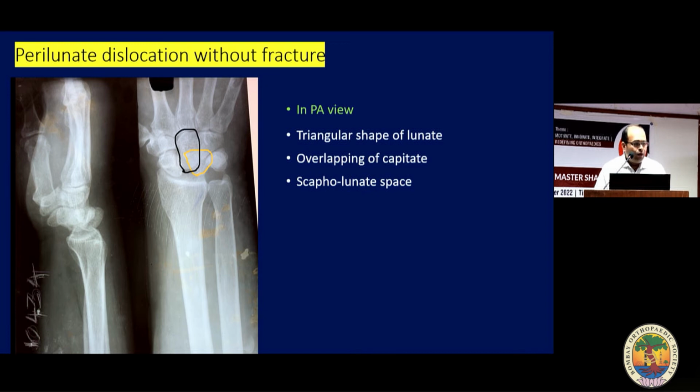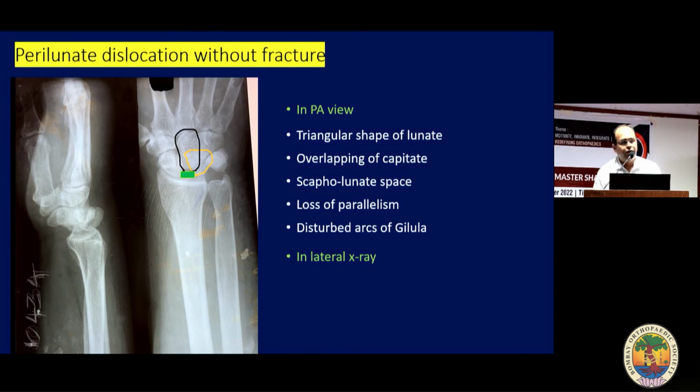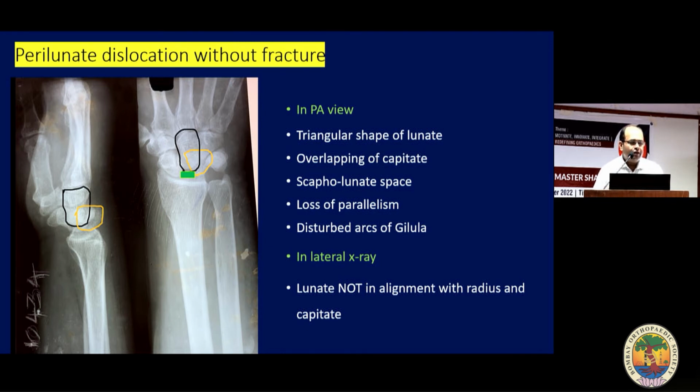Then you have to again look at the space between the scaphoid and lunate, the loss of parallelism, and the disturbed arcs of Gilula. So these are the important posterior anterior view X-ray findings. On the lateral view, we have to see whether the lunate is in alignment with the radius and capitate or not. So this is a perilunate dislocation without fracture.